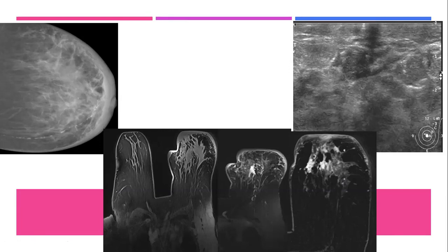And there is skin thickening, and also mass-like enhancement seen on the other breast? No, this is the same breast, these two views. You see, different level. If you look at the skin, this is the subtraction image, this one is post-contrast and this is subtraction. And there is an area of enhancement within the skin itself. Excellent. Well done. This is more important.